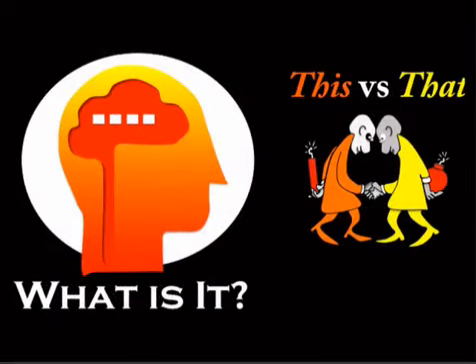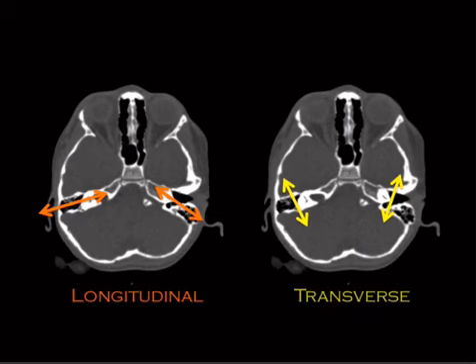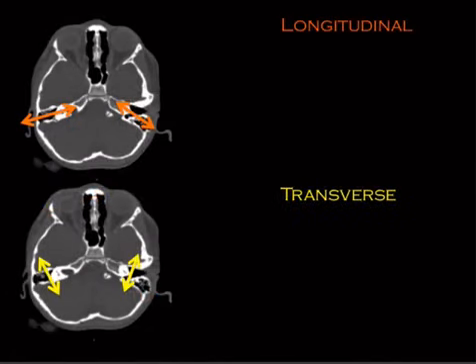Another comparative case here in the setting of trauma. Old school people like to classify temporal bone fractures as either longitudinal or transverse based on the direction of the fracture plane. Now, this is silly, right? Because reality is the majority of the time that's complex and sort of multi-directional, but you'll see lots of textbooks break them down, and there are some really excellent ways to ask multiple choice questions about this. So let's run through that.